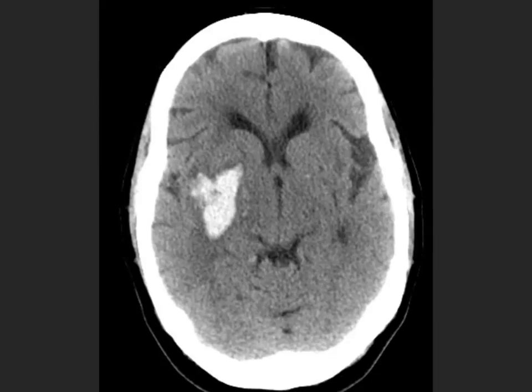The difference between normal and pathological tissues is usually much, much less than 120 Hounsfield units. So here's a head CT of a patient who has a large hemorrhage in their right basal ganglia. This was a hypertensive hemorrhage. Now, if we looked at the densities on here, that fresh hemorrhage is going to be about 70 Hounsfield units. There's no contrast on this study. The grey matter is going to be about 40 Hounsfield units. The white matter, about 25, 27 Hounsfield units. And the CSF here, near water, so that's 8.